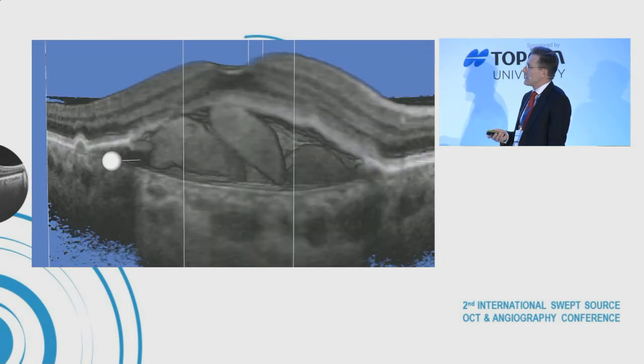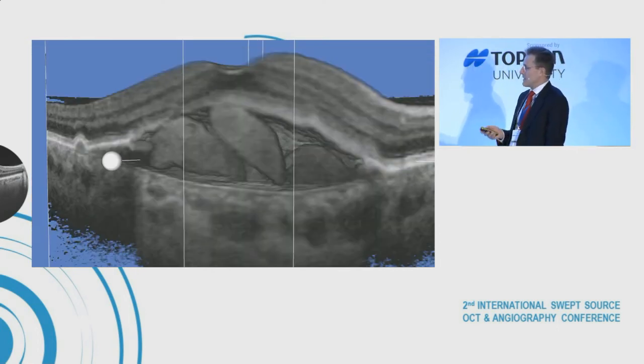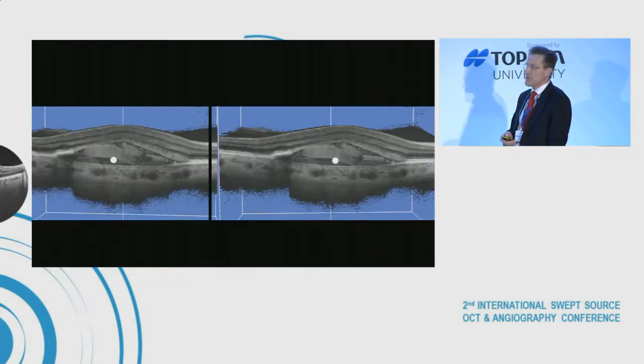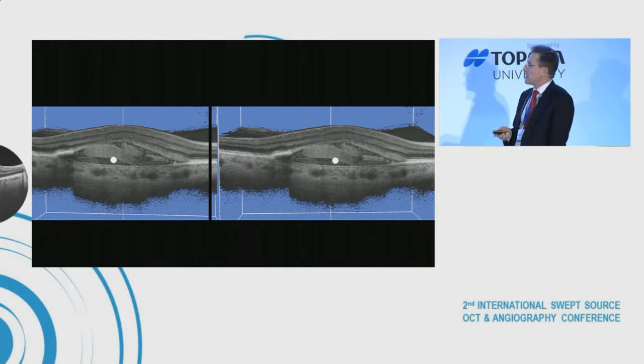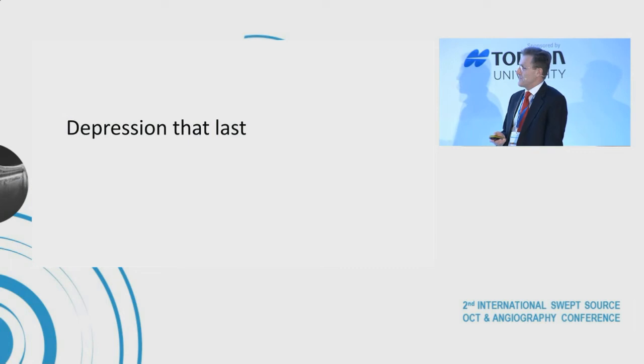But you can get even more stereoscopic impression by producing a rendition in 3D. So if we can get this out at the presentation, then you'll see that if you know how to squint your eyes, you can get a perfect 3D stereoscopic presentation of structures such as these. You can even do that in a film.